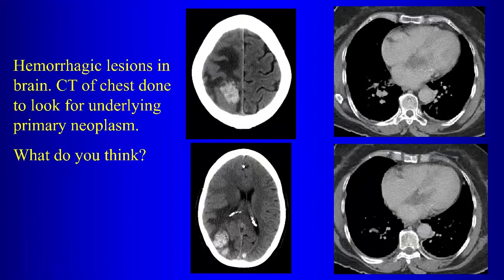Yeah, so myxomas are tumors that are very friable. Pieces of it can break off, and if it's in the left atrium, you get systemic emboli. So this is a hemorrhagic infarct, we suspect, from a piece of that myxoma that broke off. So what should we do now? What imaging study can we do in radiology to take a look at that tumor?